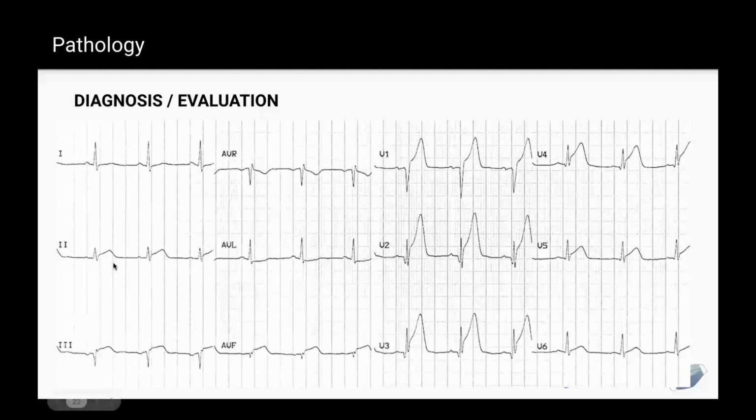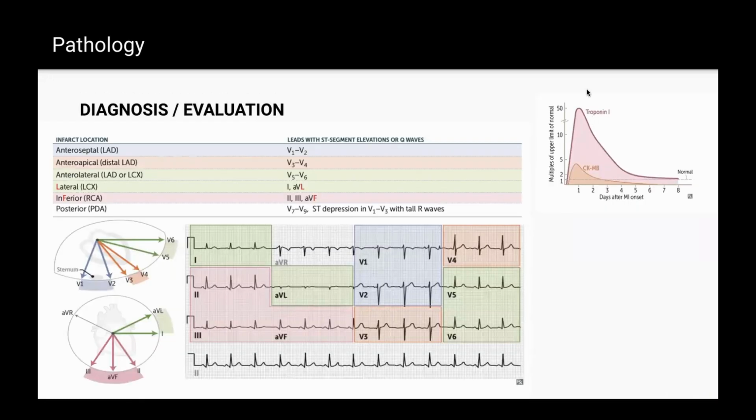Yes, awesome. So I understand what you mean. I've definitely done that before too, but I've been yelled at by one too many cardiologists about thinking I see MIs where I don't. But this is a little up, this is a little up, but these are our main offenders. It's this big, big peak here. Great job.